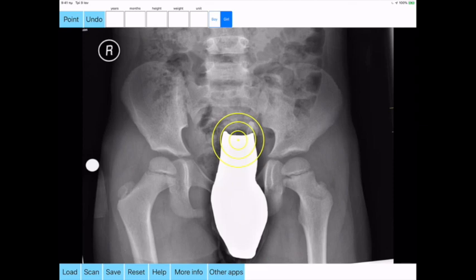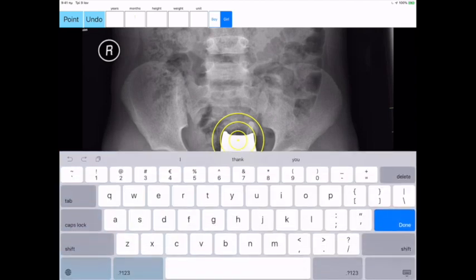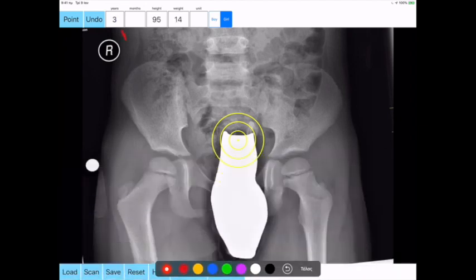In case the height or the weight of the patient is unknown, by simply entering the age, the built-in feature chooses the exact middle weight and middle height of the person, calculating the 50th percentile according to normal reference data population adjusted for gender and age. The empty boxes are filled automatically with the middle values, respectively. You can also edit one or other directly in case that a value is known.